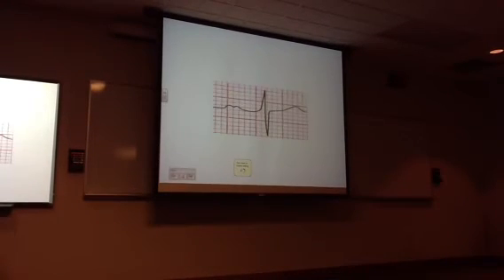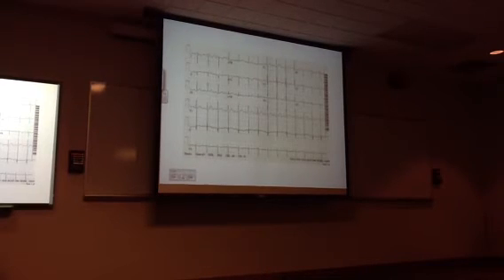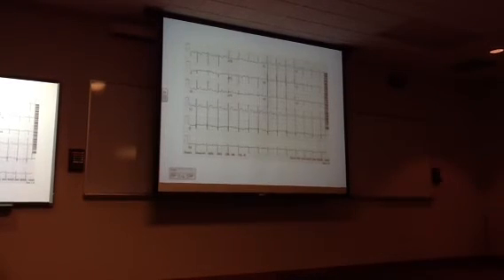Dr. Feit, can you say that's normal sinus rhythm if his heart rate is 150? Sinus tachycardia is what I would say. So if you're on rounds two years from now and your resident asks you what the EKG showed, say it is a sinus mechanism, but it's a sinus tachycardia. All right? So the pacemaker is still working. The SA node is initiating the cardiac cycle, but it is a tachycardia.